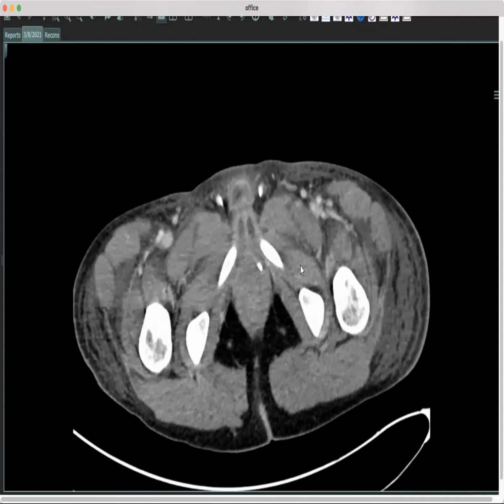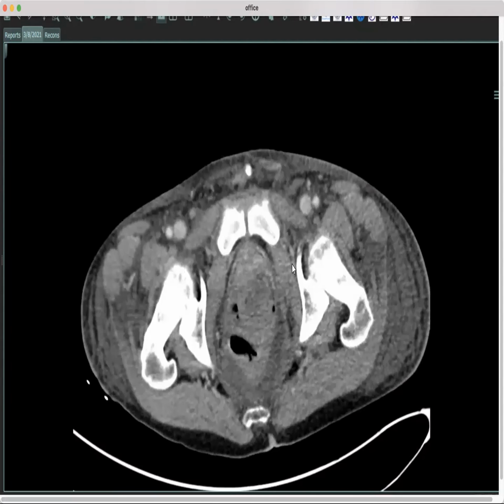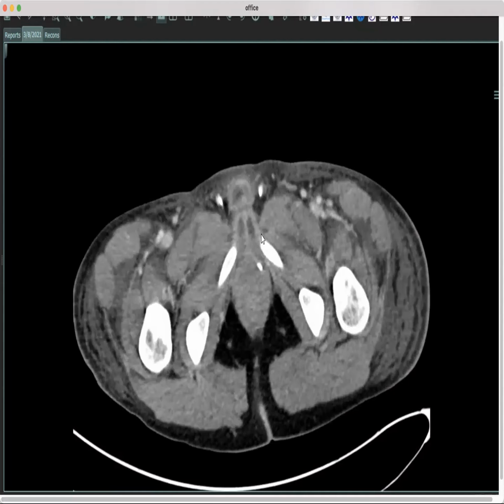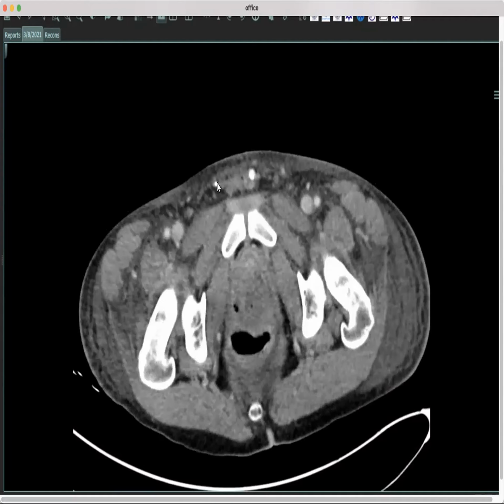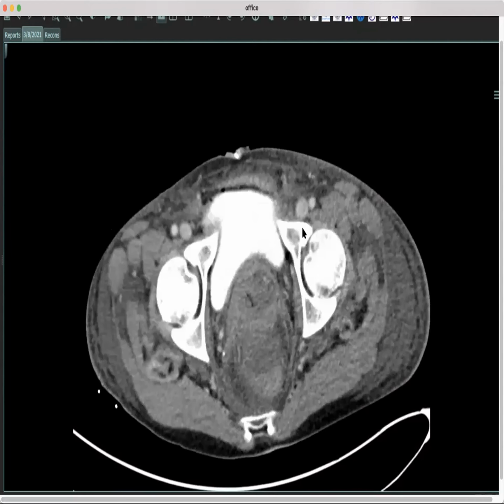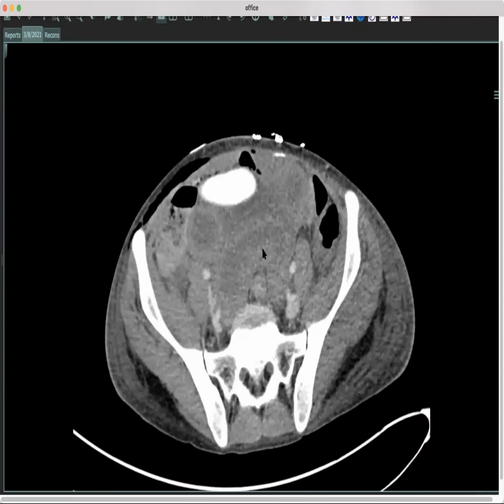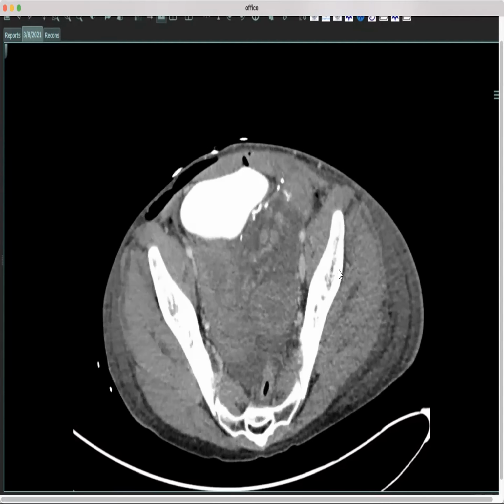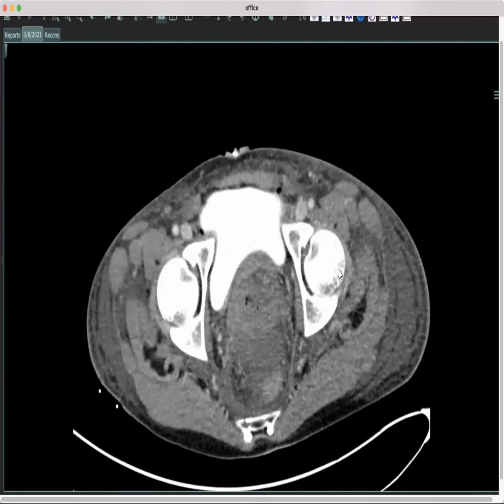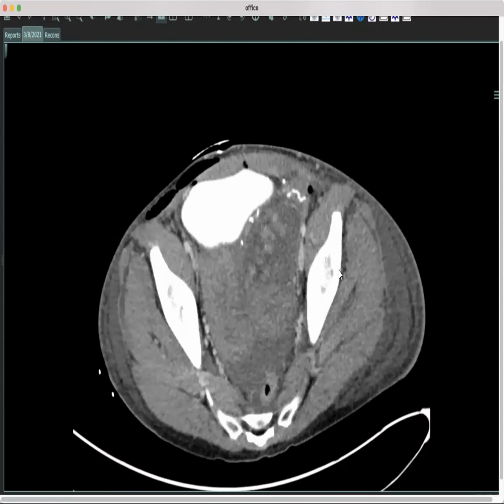So this was a male who was doing female transition and having surgery to create basically a neovagina. You can see they resected the penis and the testicles, and you can see some of the post-surgical stuff here, but they had a lot of signs of infection. And so we were looking in the pelvis here, and I don't know if you guys appreciate this, but these loops of bowel here look pretty sick to me, or I thought they looked pretty sick, and that's what I told the surgeons. Anybody have any idea what that might be or what might have happened in this surgery?